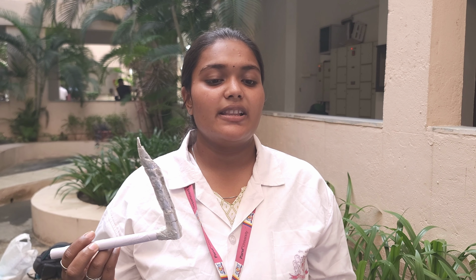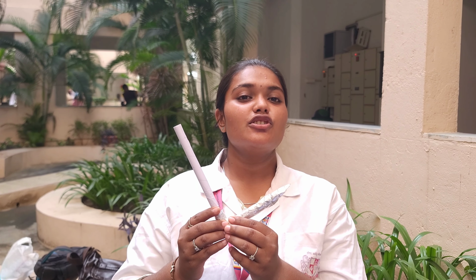What is a laryngoscope? A laryngoscope is an essential medical device used to visualize the vocal cords, larynx, pharynx, trachea, etc. It is commonly used by anesthesiologists and emergency medical professionals. Indications of the laryngoscope are: it is used in endotracheal intubation, orotracheal intubation, nasotracheal intubation, and tracheostomy.